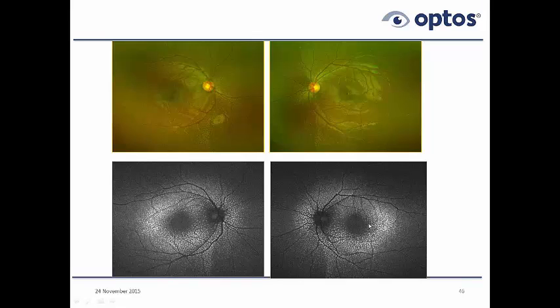Two points to be made here. One, or a few points actually. Again, symmetry between the right and left eye, which is very high. This zone over here, I might as well point out, right below, is actually thought to be the closure of the fetal fissure. For a while that was a mysterious type of line, but now we know that this sort of line or slight arc is really related to the fetal fissure closing. That's a published article within the last couple of years out of Columbia University here in New York.